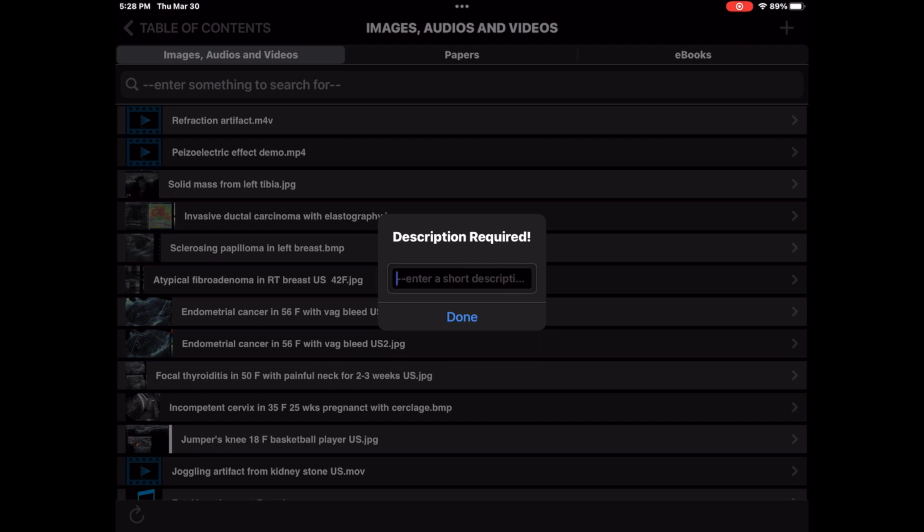It is a good idea to include some keywords and clinical information to be helpful when someone is searching for certain abnormalities, and the clinical information adds more educational value. Let's say this is a large, complex adnexal mass in 26-year-old female. Our modality is ultrasound and image number is 1.